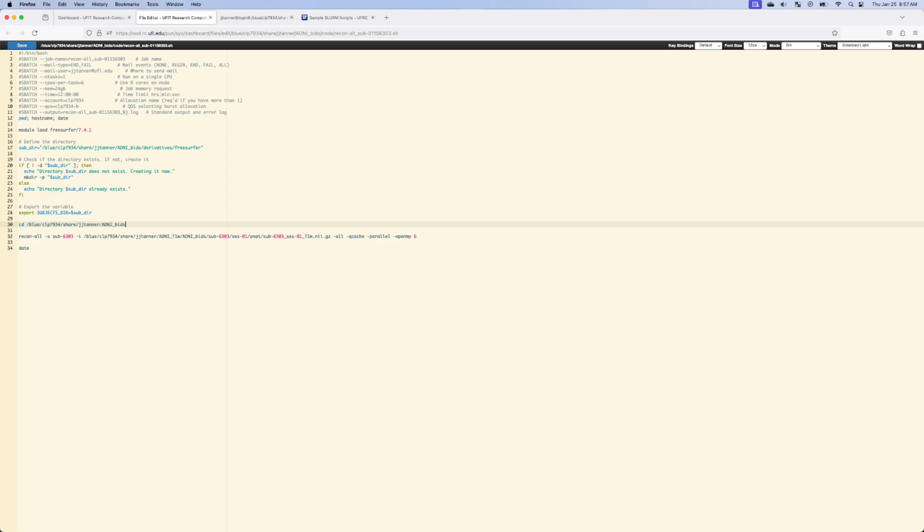Now we're ready to run FreeSurfer, and we use the command called recon-all. That'll be reconstruct the brain, and then all, this is just the name. So to do this, we do recon-all, and then we have a -s here, and then we have the subject. So I'm going to update this to be 011s, and that's this name, 011s6303.